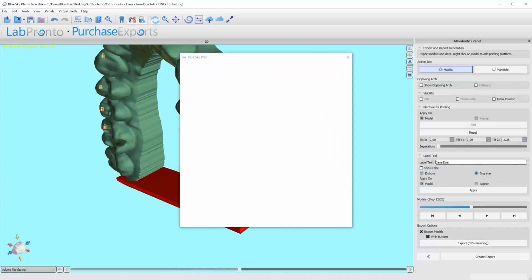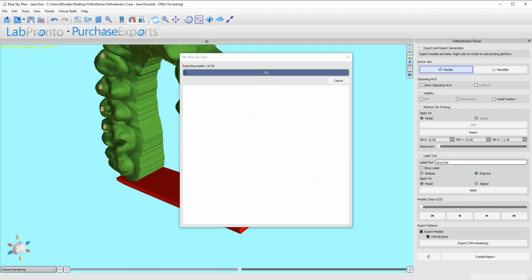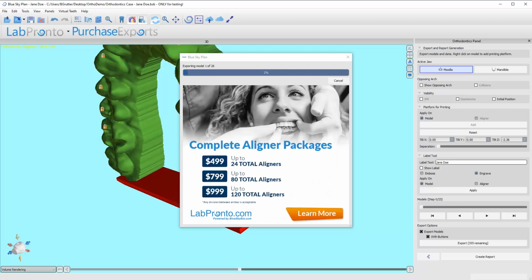So make sure you have saved your case as well. I have not mentioned that. Hopefully you know that just by working with software in general. But you should be saving periodically, because who knows? Especially if you're like me and you design cases throughout the day. You just have it up and design a case here and there between patients when you have time. It's smart to go ahead and save. That way, if anything happens with your computer, you're not up a creek, if you will.